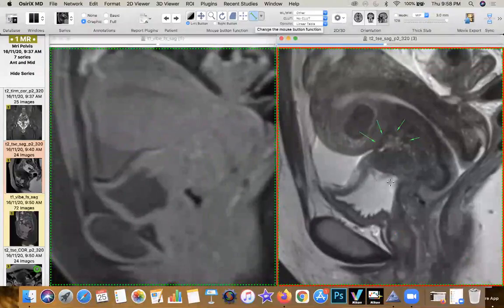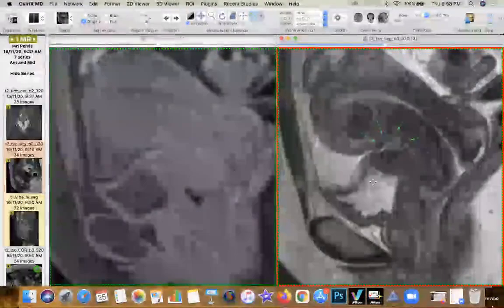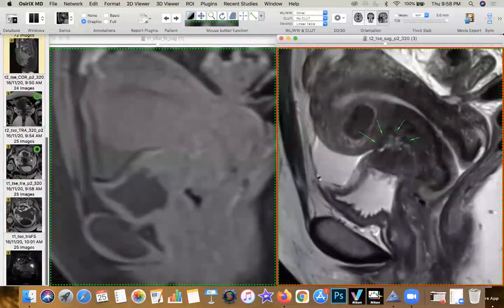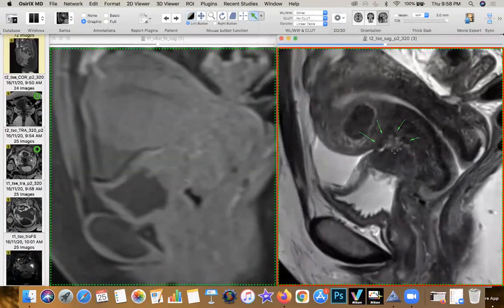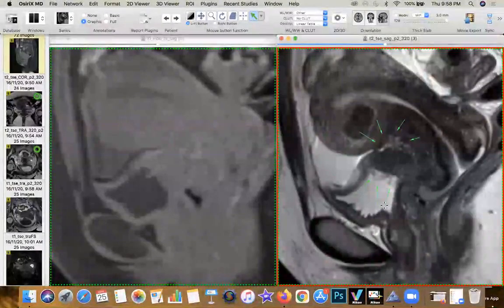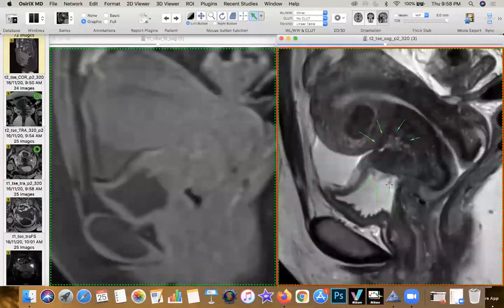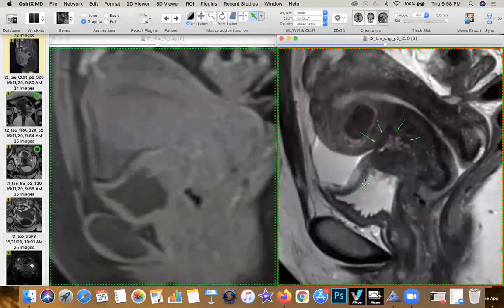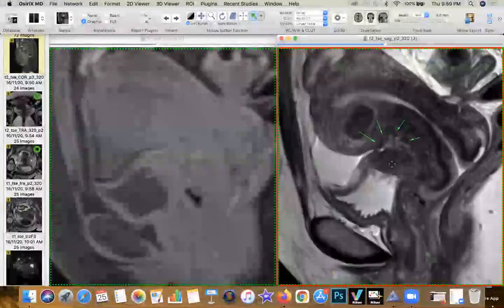Interestingly, this patient did not have hematuria. And if you note very carefully, and let me just see if I have, oh no, I don't have a post-contrast here. But if you look very carefully, this so-called inflammatory reaction in the bladder wall, which is transmuscularis, has incited a mucosal hypertrophy, which has caused a so-called undulating or pseudopolypoidal appearance, what we call bullous hypertrophy of the bladder wall mucosa, which is a secondary epiphenomenon of the muscularis infiltration.